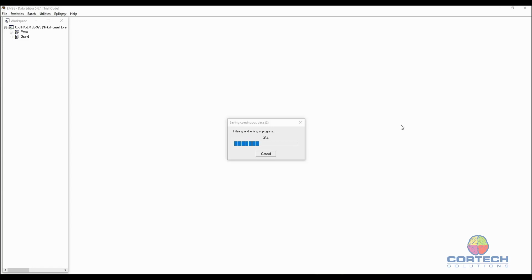So it's applying the filters, and in particular the digital IIR filter, to the entire data set with any warm-ups at the very ends of the data, and then it's saving this to a new file, which we'll see. And it's going to do that to both. So we're in a loop where we're doing this with both data sets, yours, Nikki, and also Lloyd's data set. So now it's doing the same thing to Lloyd's data set. We'll see the result in a bit.